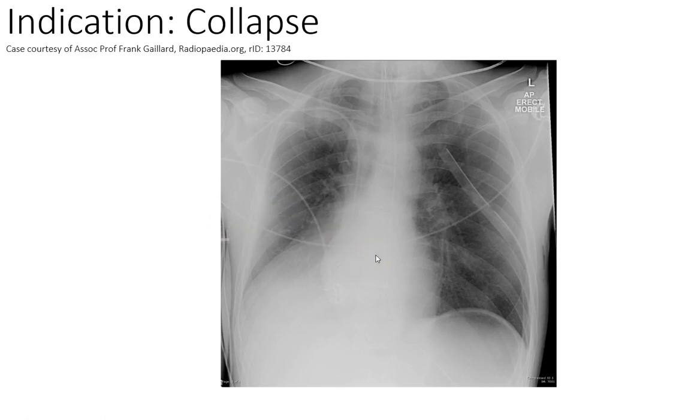Okay, so now having a look through this X-ray, which is a bit different from some of the others that we've seen, we can still look at the patient's position, but you can see that it's actually become really hard to see where the spinal column is. We can still see the spinous process in there, and we can still see the clavicular heads, but this one's all the way over here, and this one's right up here. So actually there's quite a significant element of rotation, and that's going to make interpreting this X-ray much more challenging, because it's going to cause some shift of structures.